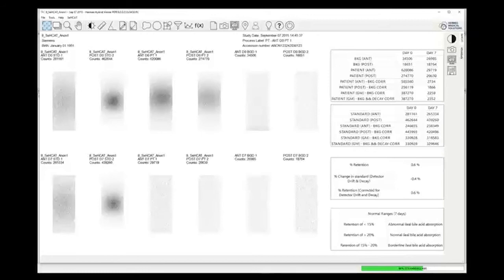The processing would just be, as Lynn said, you can load it in. It will do everything for you, come up with the result and it would just be a print screen from here. But a check that you might want to do is to window down on the backgrounds to see if there's any striping.